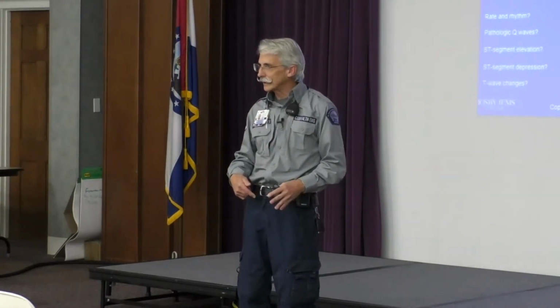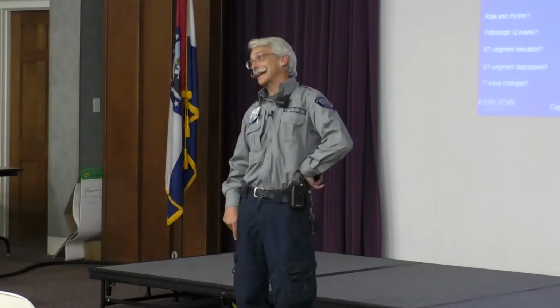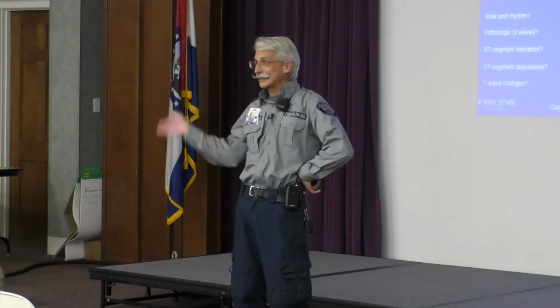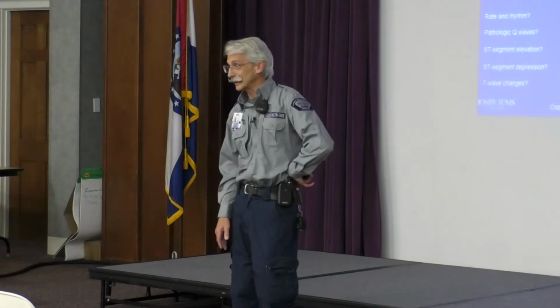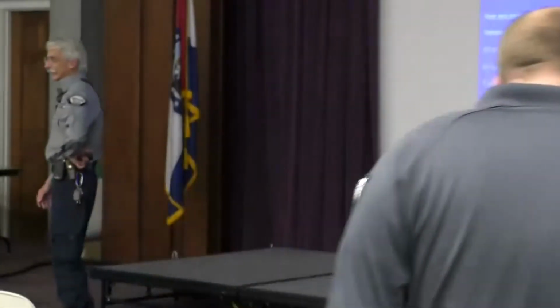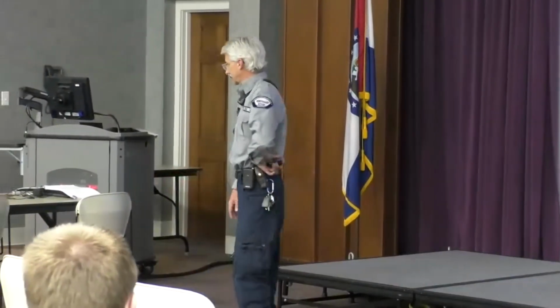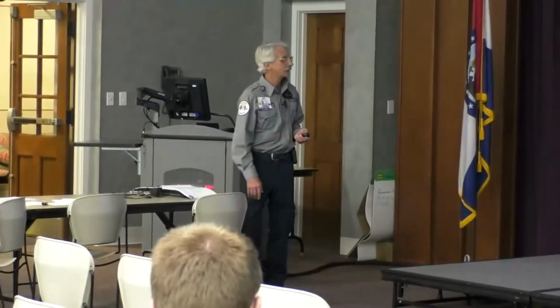What's that tell me? Whether 2, 3, or AVF have anything in them, and if they do, I'm not giving nitro. I still need to do a 12 lead, but I know when not to give nitro at this point. It's not the only way in the world to do it, it's just a thing. It is a little bit of a cheater's way, yes.